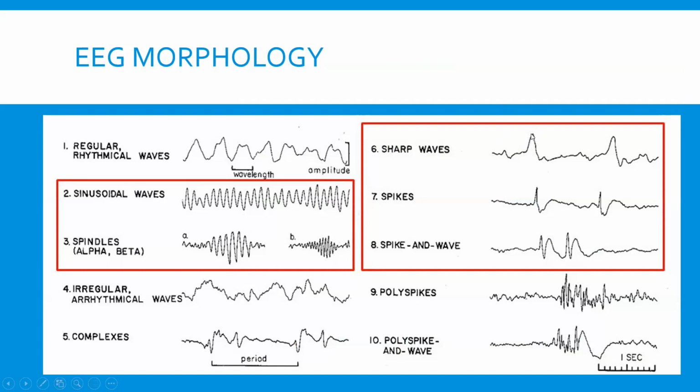They look very different from what the normal EEG looks like. It just looks very abnormal. There's this pointy thing jumping out off the baseline. So these are called sharp waves, and spike waves are basically the same thing. Spikes just look sharper and more narrow. Basically, spikes are more narrow sharp waves. One of my mentors says spikes look very uncomfortable to sit on. If you see how pointy it is, this is a spike wave.